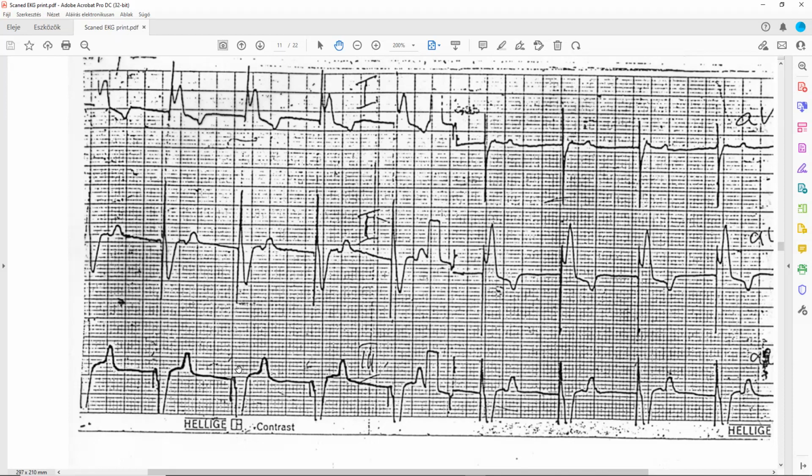It's not a ventricular escape rhythm. This is called an artificial pacemaker. They put a pacemaker into the ventricle. The pacemaker fires very rapidly, and after the impulse is propagated, the first phase of the QRS is fast, and the next one is nicely round and elongated.